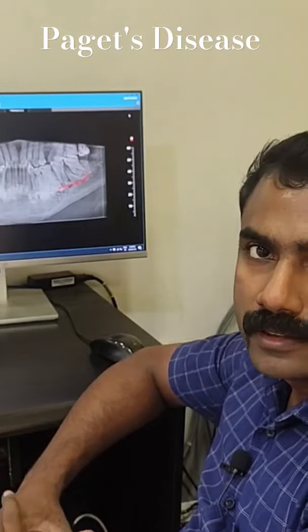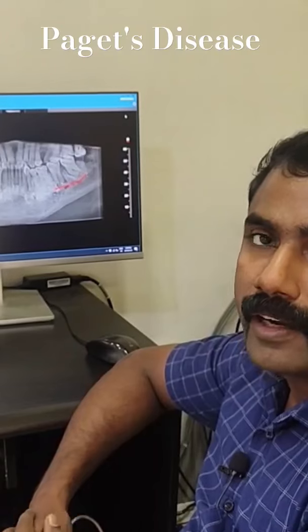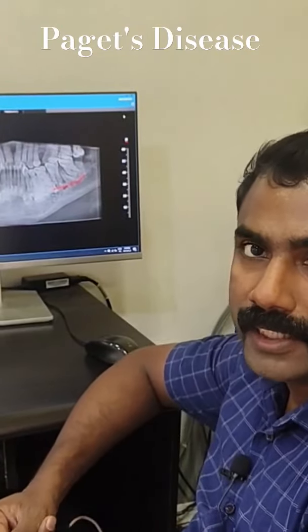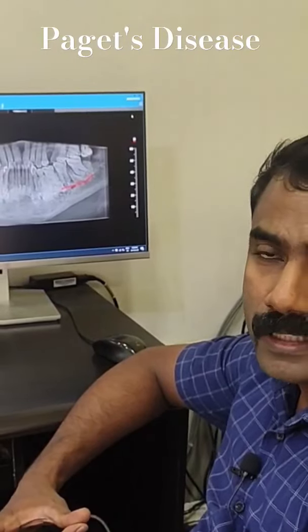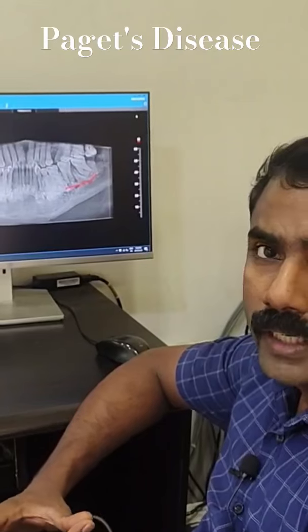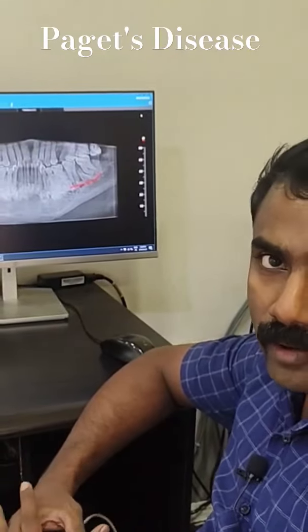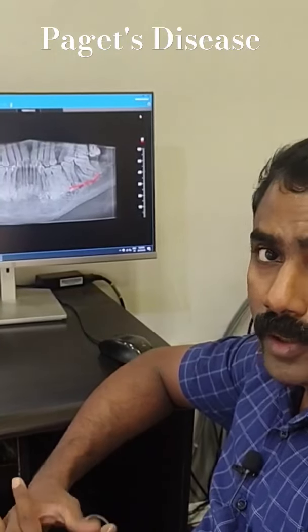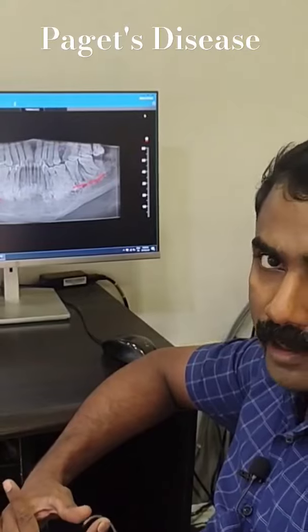Today I am going to discuss an interesting case of Paget's disease, the cone beam CT finding of a patient with Paget's disease. Paget's disease is one of the commonest fibro-osseous lesions. Here I am going to show you a case of isolated Paget's disease in the mandible, which is not that common. Let's look into the radiologic features of Paget's disease of the mandible.